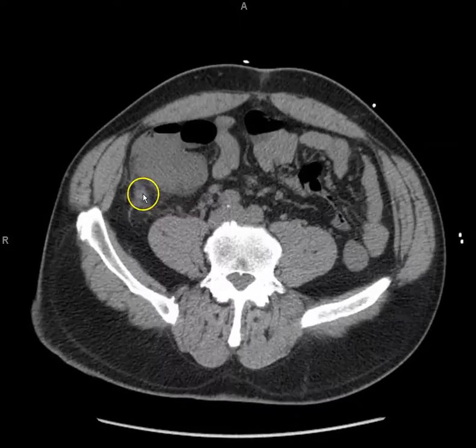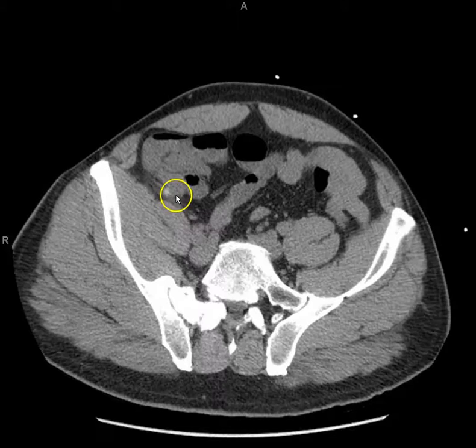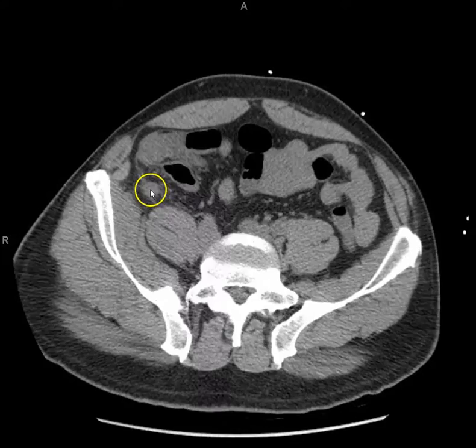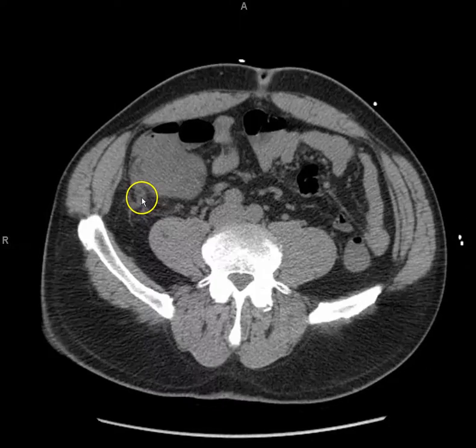It's a little light. What is that? Appendix. So you see, here's the colon. Here's the little fecalith, or an appendicolith in this case, and here it keeps going and going and going, and it's a blind end. It stops. Right? So what is that?